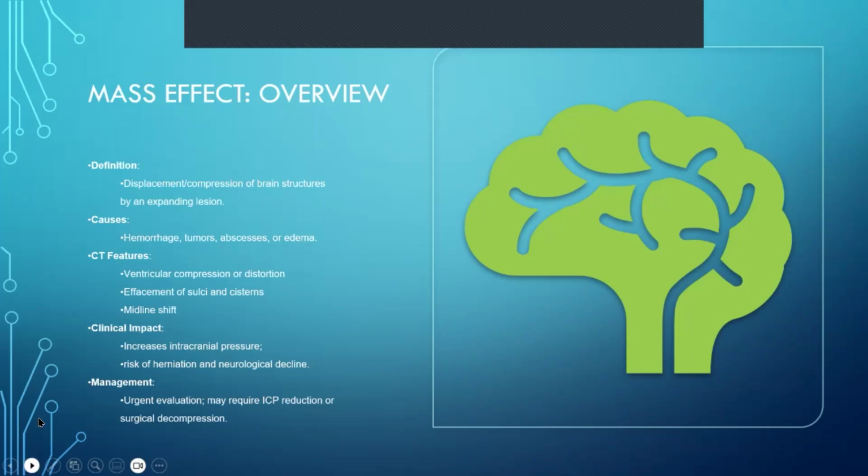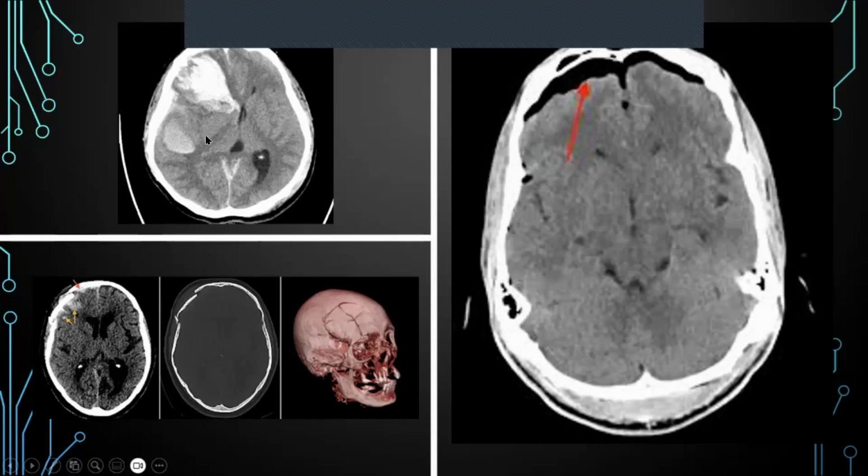These were just some other ones that I wanted to show you guys just so that you'll know what it looks like. This one here is an intracerebral bleed, all right? So that's when you have bleeding within the cerebral tissue itself. Here are some contusions that we can see over there. And these are what skull fractures look like, and once you've reconstructed, it's quite easy to see skull fractures as well.